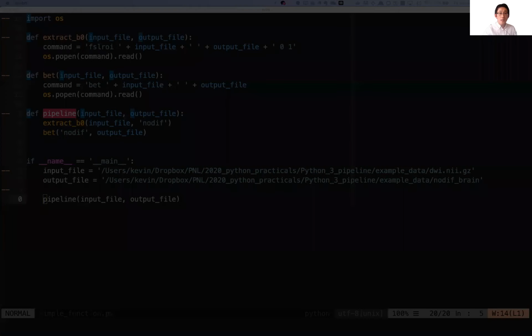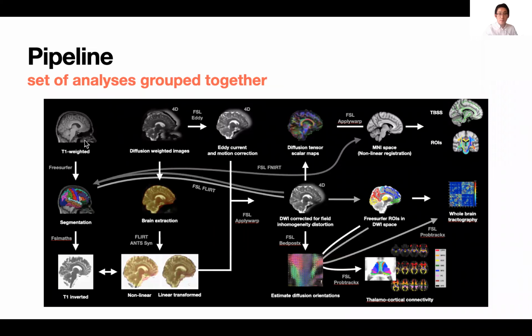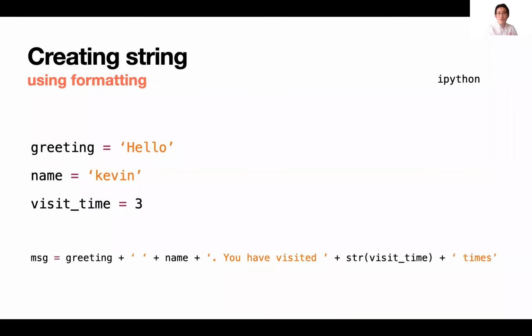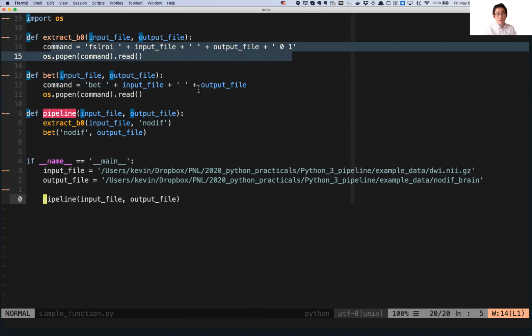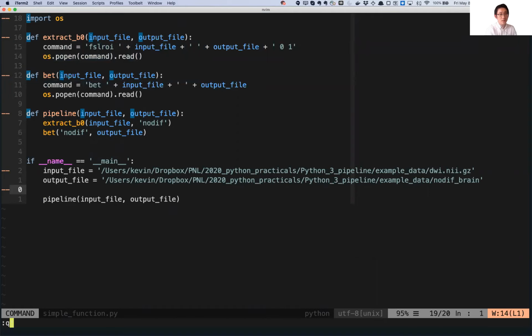Okay, now you just made a part of the pipeline. You can now say that you can build a pipeline using Python. Yeah, but there are quite many uncomfortable things in the script. You remember, I don't like this. It's very confusing to write something like this. So there's a better way of doing this.